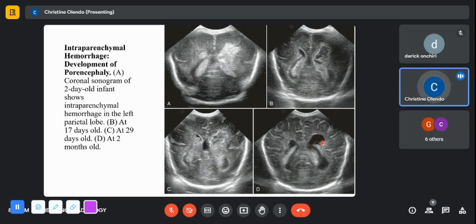So this is CSF, and it has an abnormal communication with the ventricle in that area. Yeah, it's known as a porencephalic cyst. That area of infarction becomes cystic encephalomalacia, and when it communicates with the ventricle, it's called a porencephalic cyst. If it just remains within the parenchyma, then it's just an encephalomalacic cyst.